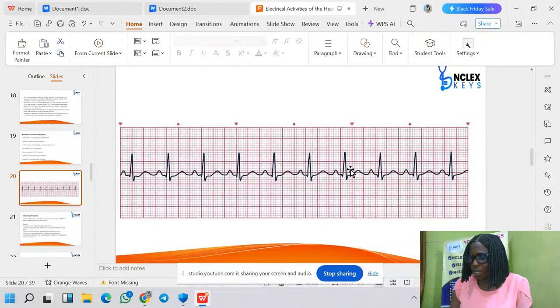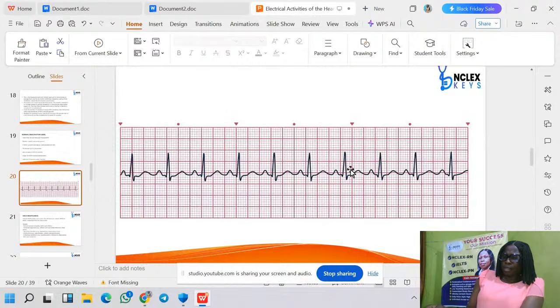The pulse is 120 when you select 30 boxes. Nurse Abigail. Okay. How many people can see this pulse to be 120 truly before we adopt it? Is this pulse 120? I'm waiting for more responses. What's the pulse of this patient? Okay, 40 large boxes. Okay, thank you.